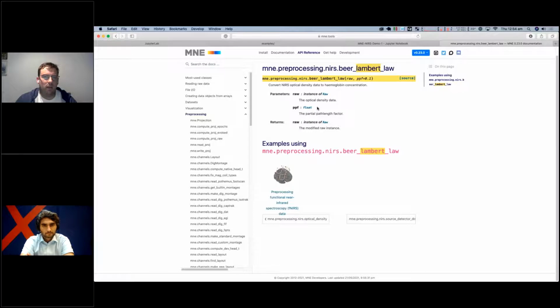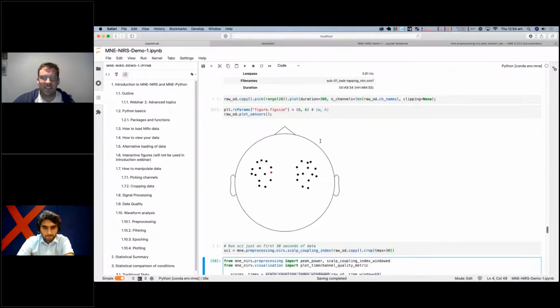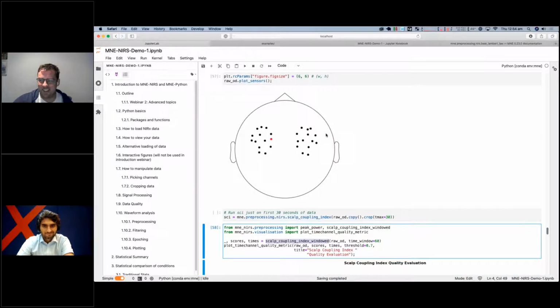It's taken automatically from the 3D locations. And I'm also thinking about in the near future making this age dependent, but we haven't got around to that yet. But you could do that manually. You could set this value for each person based on that Shortman paper where they provide an age dependent equation. So a medium level of customization to answer your question.